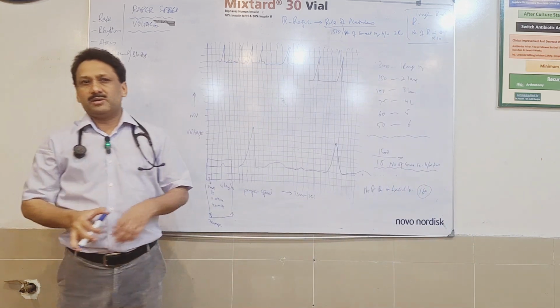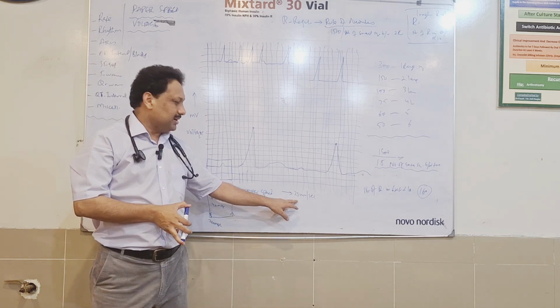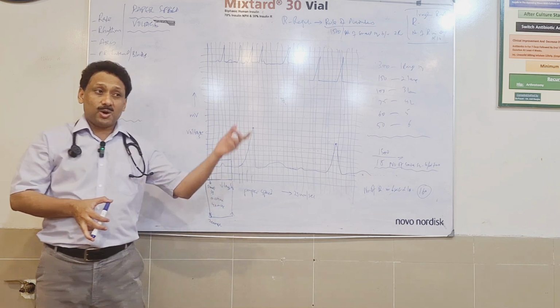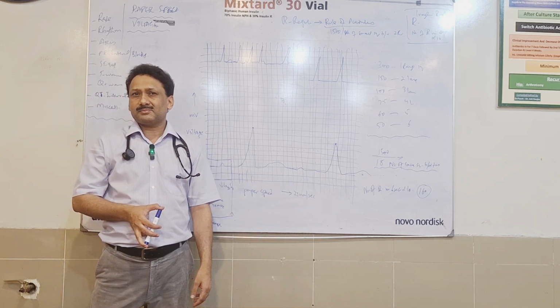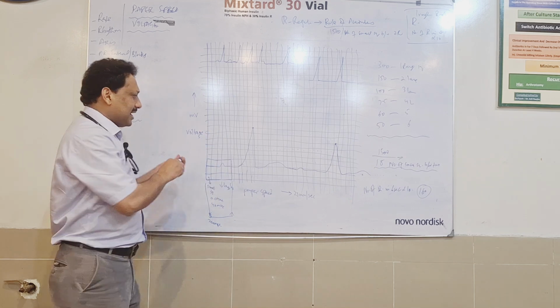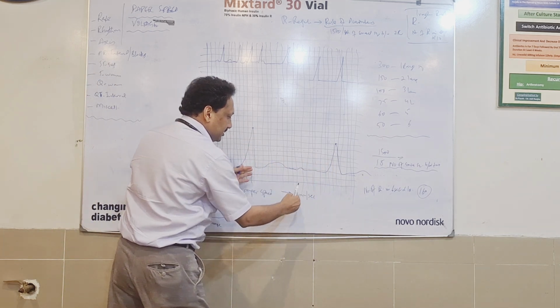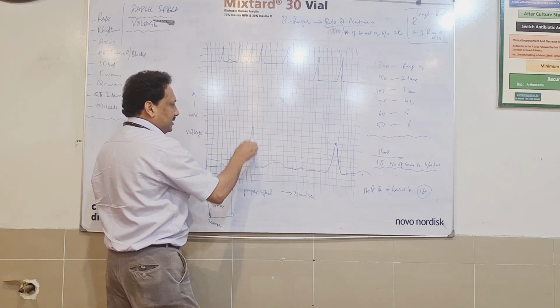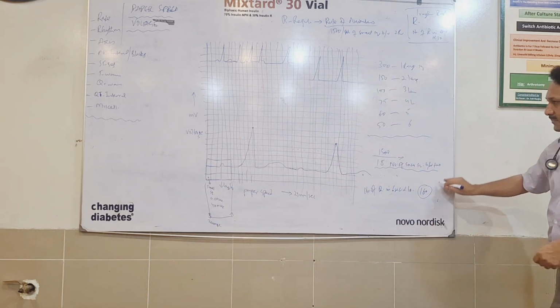It is important to have a look at the paper, to see whether the machine is working at the speed of 25 mm per second, because on occasions it can be 50 mm per second. It means the stylus, like this R, after this R, if I make the speed 50 mm per second, then it will be doubled. The next R won't be coming here, it will be coming almost here.